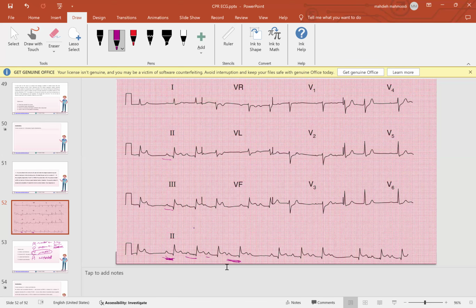So what is this one? It's a drop. Type 1, ma'am. Yeah, it's a drop. So as you can see, you have an increased PR interval and gradually increasing PR interval. Fine, so what is this? AV node block type? First degree. Type 2. Second degree type 1.